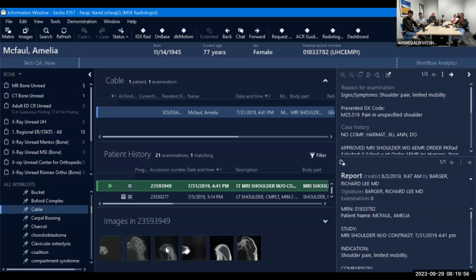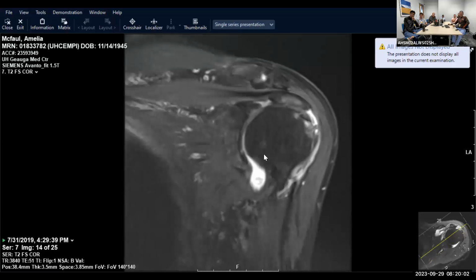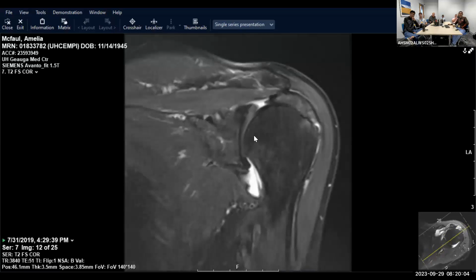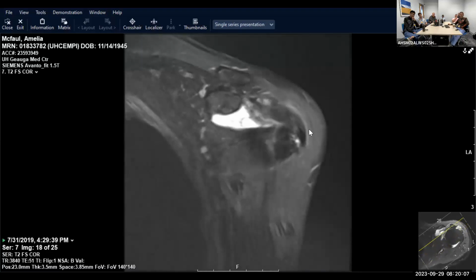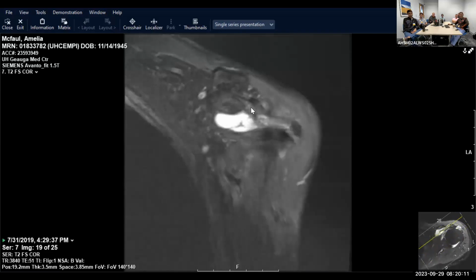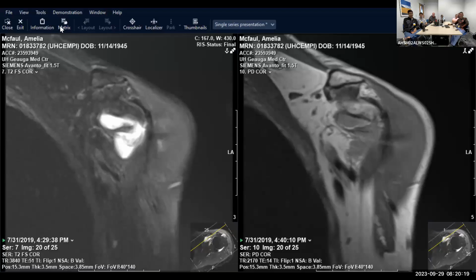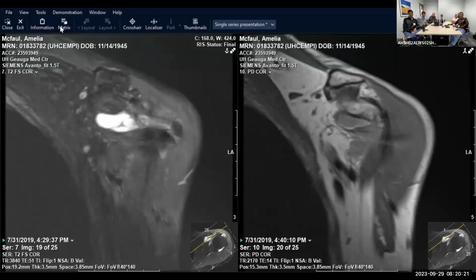Okay, so we're sharing screen. Let's get back to this. Retrieve. Okay, it's not the best looking cuff, unfortunately, but rather than keep looking, we're just gonna make this work, fortunately, given the circumstances. So I start far anterior, and I'm looking for my coracoid process. I'm gonna hang the coronal next to it just so.